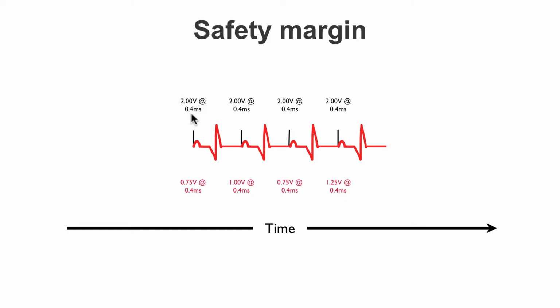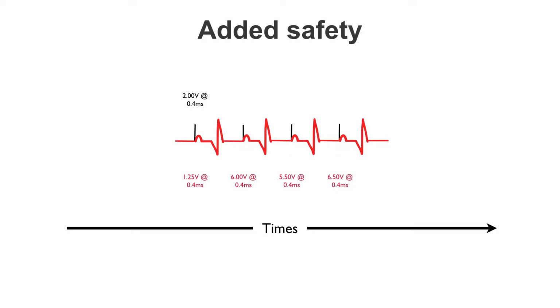The output pulse is always large enough to trigger the depolarization. Pacemakers are also cleverer than this. Although you may have set the output pulse to 2 volts at 0.4 milliseconds, the pacemaker has a safety mechanism to deal with the occurrence of a suddenly large threshold.